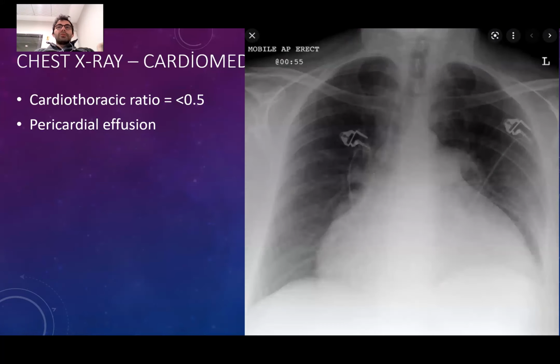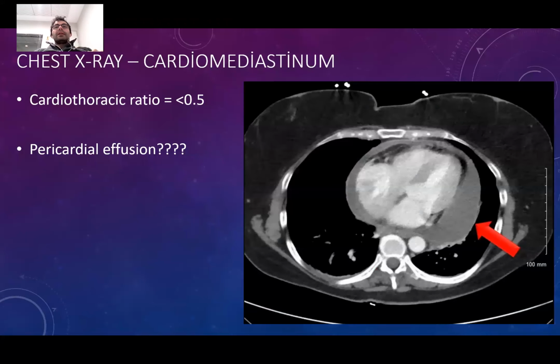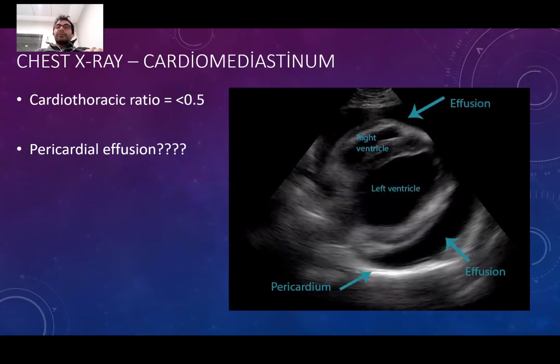This you should remember though. If the heart is very big and it looks like a very big bag, a big plastic bag, then you should always consider pericardial effusion, which can be fatal, life-threatening sometimes. It happens when there's a big amount of effusion, it just dilates the pericardium, okay? On CT, it looks like that. And on ultrasound, it looks like that, if you remember.